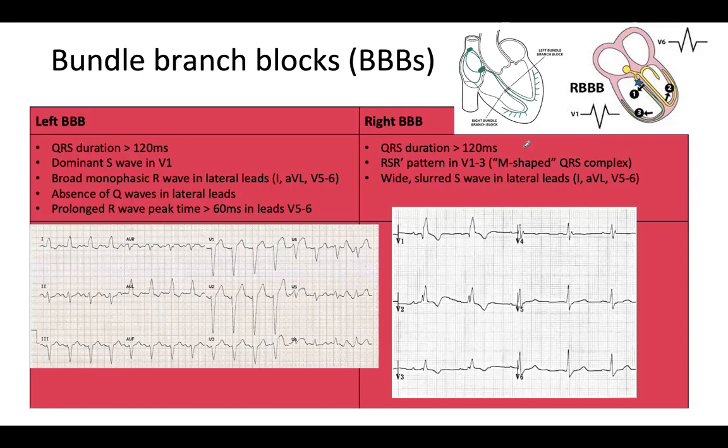Okay, but if you have a bundle branch block, so either a left bundle branch block or a right bundle branch block. I'm not sure if you guys can see me pointing at things. Logan, can you?